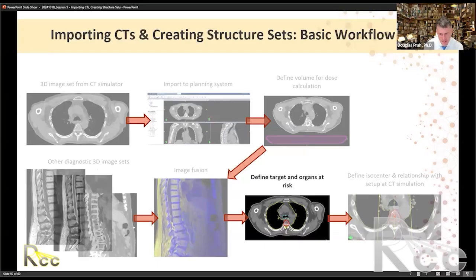If there is benefit, for example, a left breast tends to benefit from having the heart a little further away from the chest wall. So in those cases, that works out pretty well. Also, if you're treating something internally and there's large organ motion, you might find that is also helpful. In that case, you can look at it both ways and then make an evaluation. And so the ISO would be just placed on whatever scan it was that you were planning to treat on.